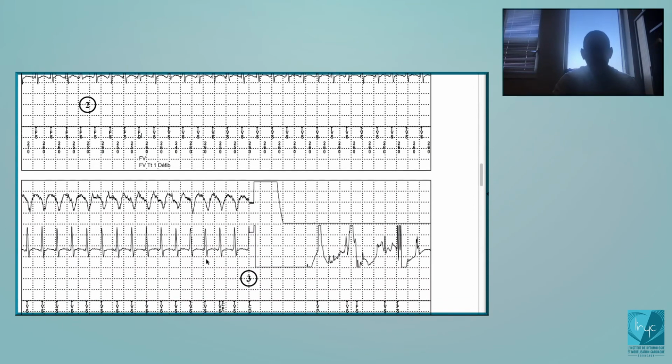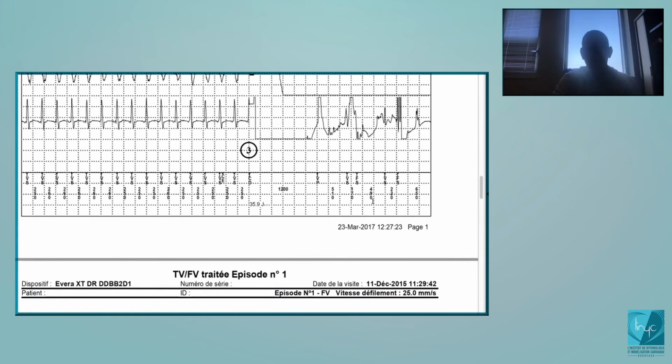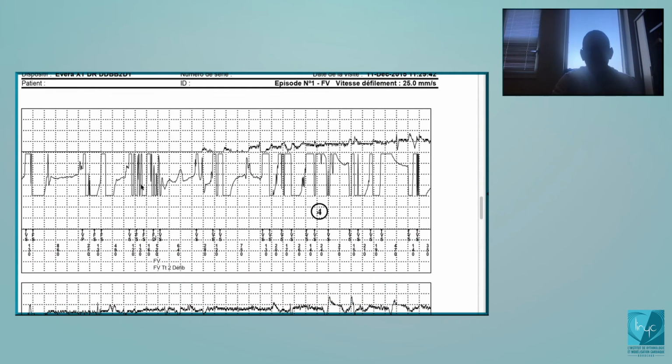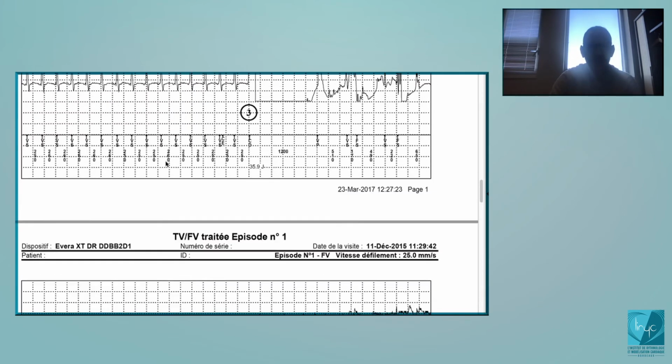detection. One shock is delivered, and after that there is a reduction of the arrhythmia, but you see here these signals, very huge amplitude signals, and that's clearly a problem of lead dysfunction. And you see the difference between the signals, absolutely no doubt. It's not so difficult to diagnose also. So we expect that it's really going to be possible to differentiate this from this.